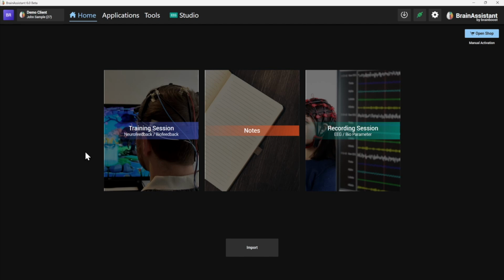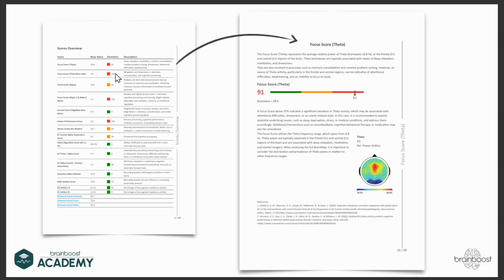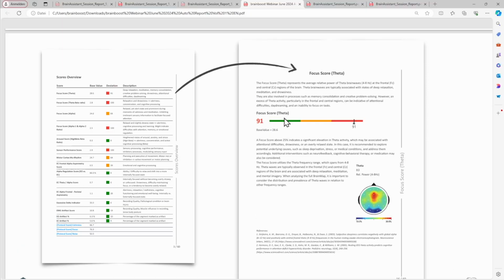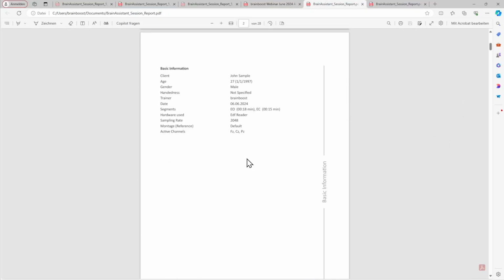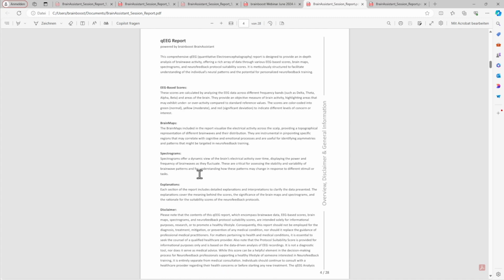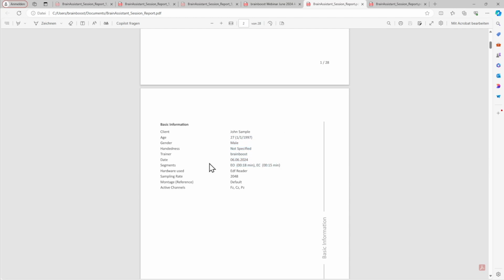Very nice to have these specific questions. One thing, if you have a few seconds, I had this question in the German webinar. Some people said, okay, I really like your report. But one thing, for example, I don't like that page, let's say randomly, okay? Or I don't need this info.